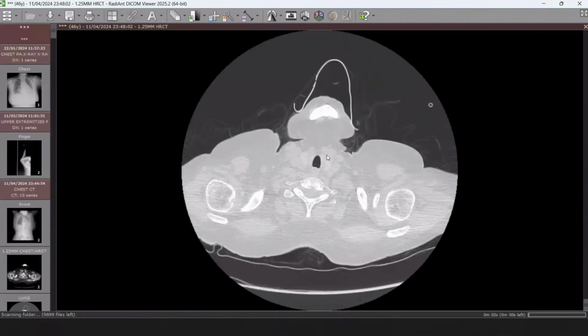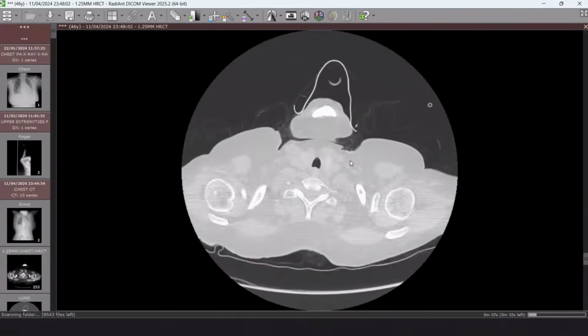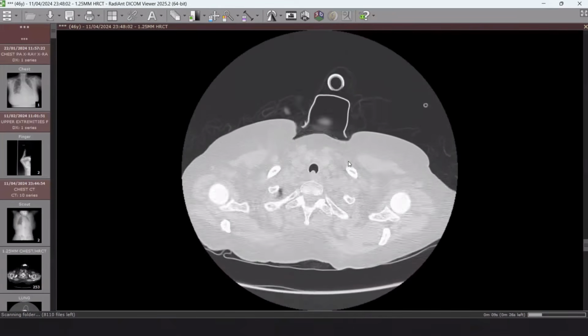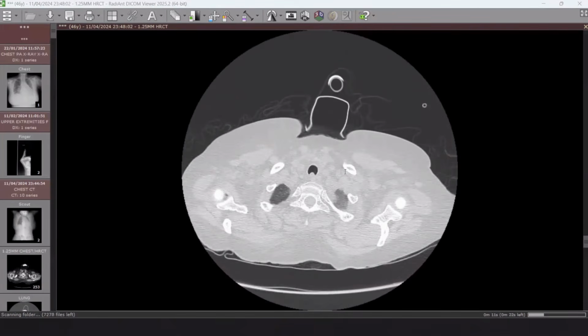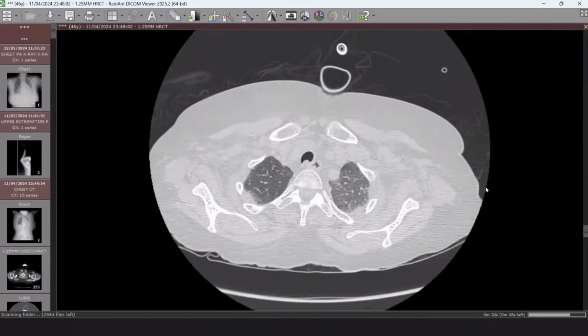Very nice. Can you please send for me a request for remote control? Yes, sir. Requesting. Yeah. It's a very nice case for discussion, and at the same time, it's a relatively complex case. Let me zoom for you first. And okay, go ahead.